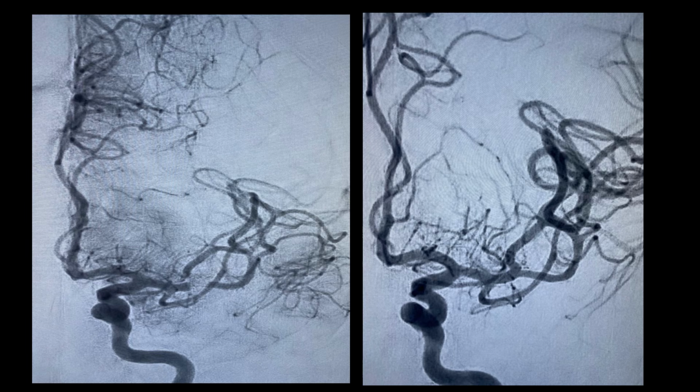So moving on. Here we are able to see the angiogram images. Here we are seeing a small clot, a very tiny clot which is present in the M1 M2 junction of the left middle cerebral artery. Pre-procedure, it is also going into the superior divisional branch. Post procedure, we are able to see it is completely clean. There is no clot at all.